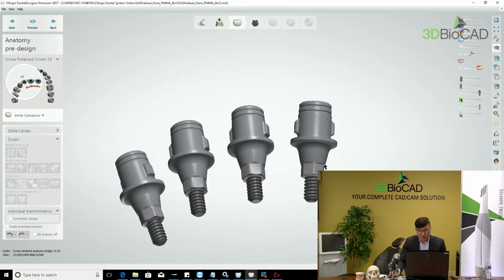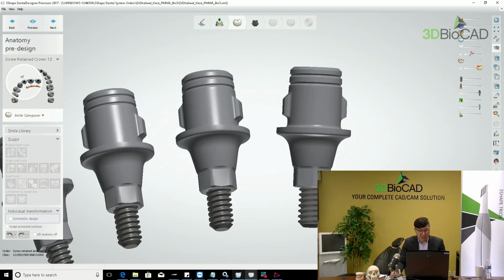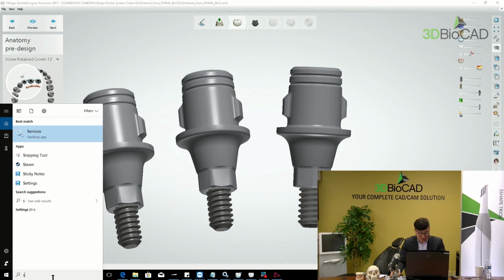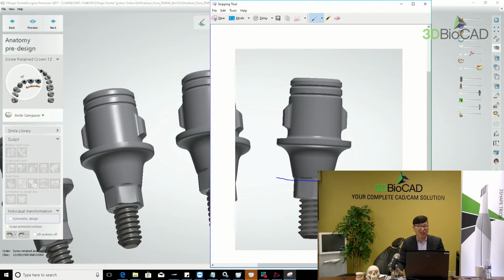So be super careful when you cut this out, because some implants are okay to trim that out, from an engaging one to make a non-engaging one, but with some implants, if you cut it out, sometimes you can cut out the screw channel's stop position, so your screw just goes down and can go through your titanium base.